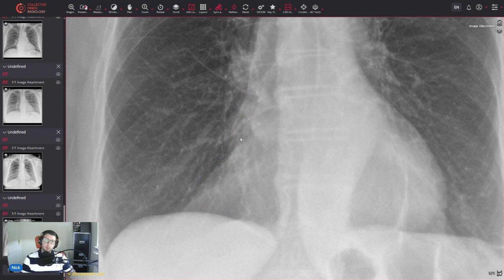It's grey in density, often continuous with the heart border in a triangular shape. You maintain that crisp clarity of the hemidiaphragm. So if it was lower lobe collapse or consolidation, because of the silhouette sign, essentially it's sat against it, you wouldn't see the hemidiaphragm contour.